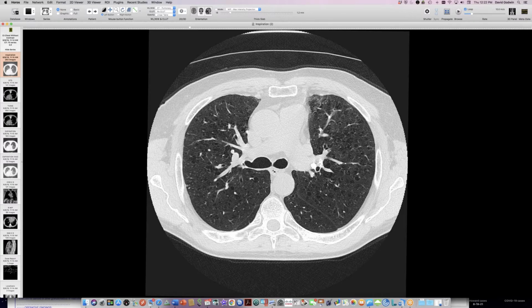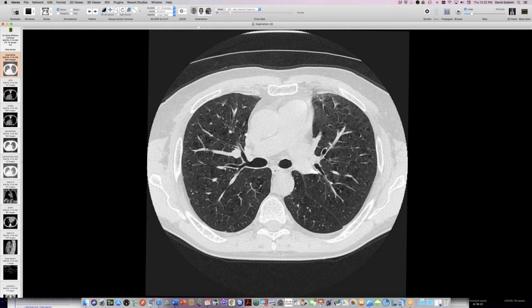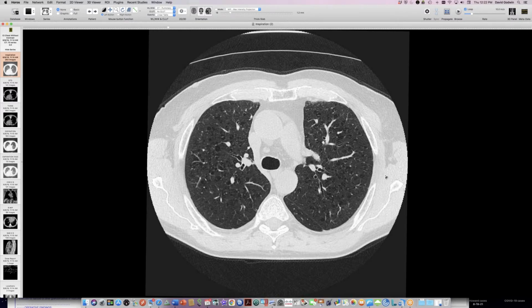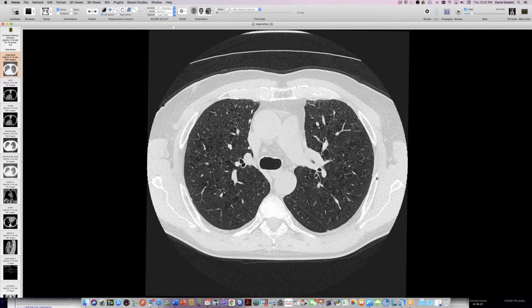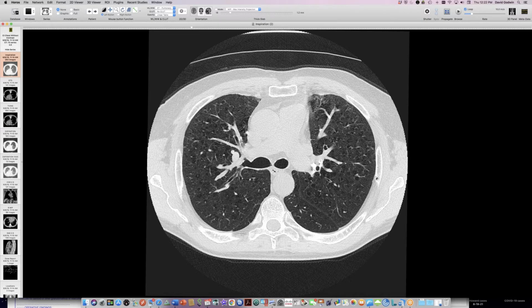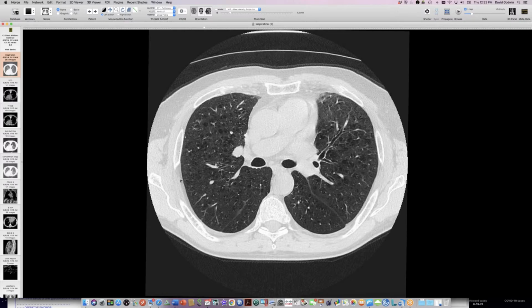This fellow was exposed to some dust storms in the Palm Springs area of Southern California. So he breathed dust for a few days, and his symptoms seem to have developed after that. And so he's got a variety of these little subpleural dots. He did have a lung biopsy, and there was a question, could this be silicosis? If you've got confluence of these little subpleural dots like that, which represent dust that's carried out in lymphatics to the edges of the lung, you call it pseudoplaque if it starts to coalesce.